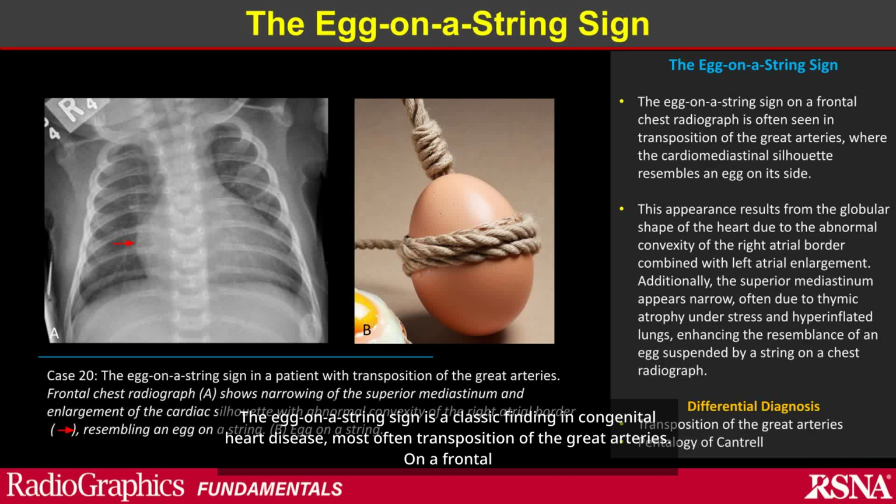While most strongly associated with transposition, it may also be seen in conditions such as pentalogy of Cantrell. Recognizing this pattern is crucial in neonates and infants presenting with cyanosis.